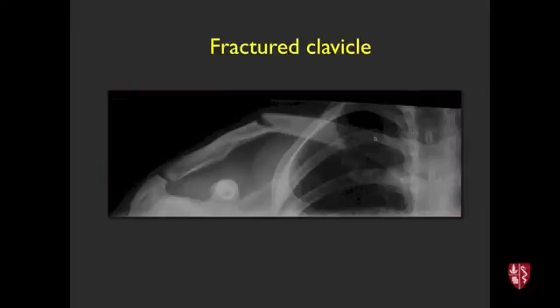So, easy example, right? Tony Romo, right? Last week he snapped his collarbone in a game. This is not Tony Romo, but something like this could have happened. Easy to see this fracture. That's enough to make the diagnosis, enough to help determine treatment, typically, for something like that.